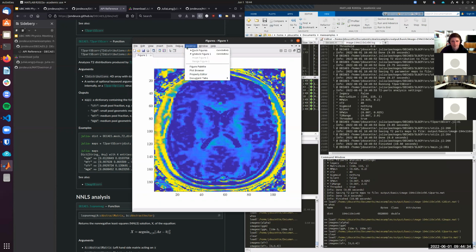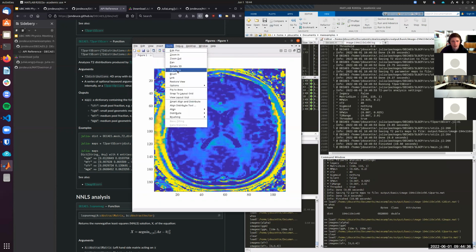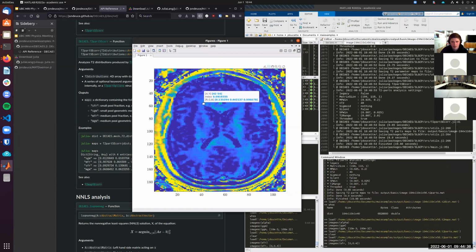Where's my data tab? We can look here, and we get some values like we might expect, between 10% and 15%. It nicely highlights the white matter. And it's very small in gray matter regions, forced to zero thanks to our Gaussian prior, or our regularization rather.